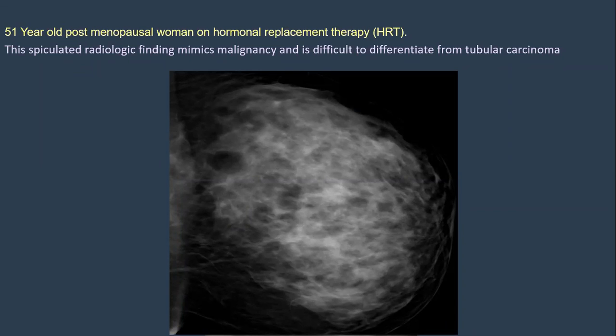Middle outer, or middle, you mean mid third? When we talk about the middle third, this is the anterior, this is the middle, and this is the posterior third. You are talking about the middle third of the breast in the depth? Yes, in the depth, in the middle third. So, okay, outer or medial or central? Central. This is excellent, well done. You mean this? Yes.